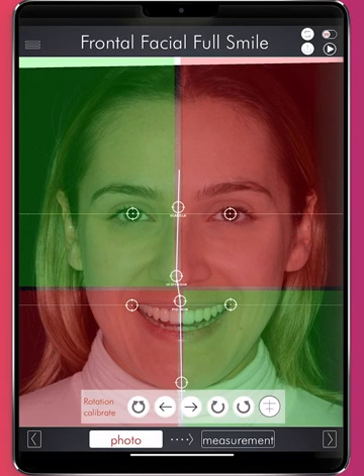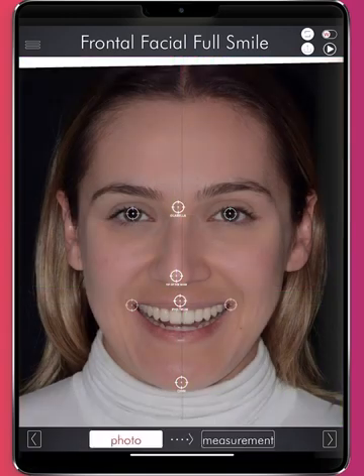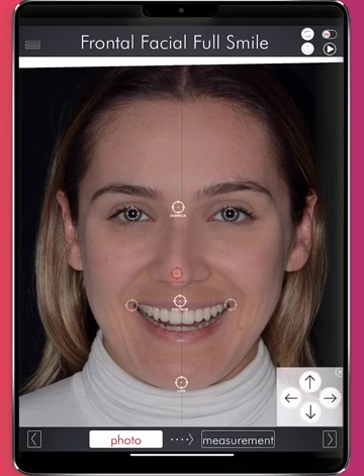That's important to know because everything what we do has to be in harmony with the face, and we design the new smile according to the facial flow, so we need to avoid tension in the face by crossing lines. It means when the philtrum and the chin go in one direction, our smile design has to follow the direction instead of creating a smile design against the flow. We move the picture in the middle of the screen. That's going to be our dental midline of the new smile.